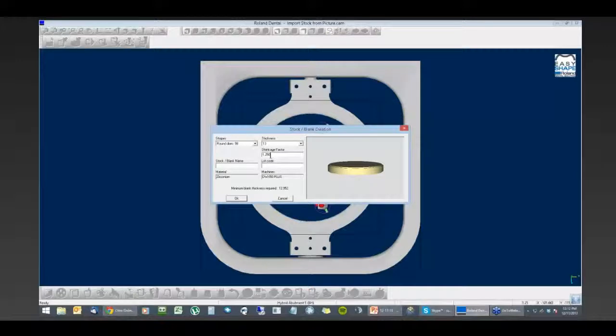So our shrinkage factor, because this is zirconia, I'm going to put in a bogus factor of 1.224. You would get this off of the disk directly. You would specify what the thickness of the disk is. And just like when you're creating your disk normally, it's going to also tell you down here, based on the STL items that you've imported, what the minimum thickness of a disk is that you're going to need. So you'll know even before you create this disk to bring it in.